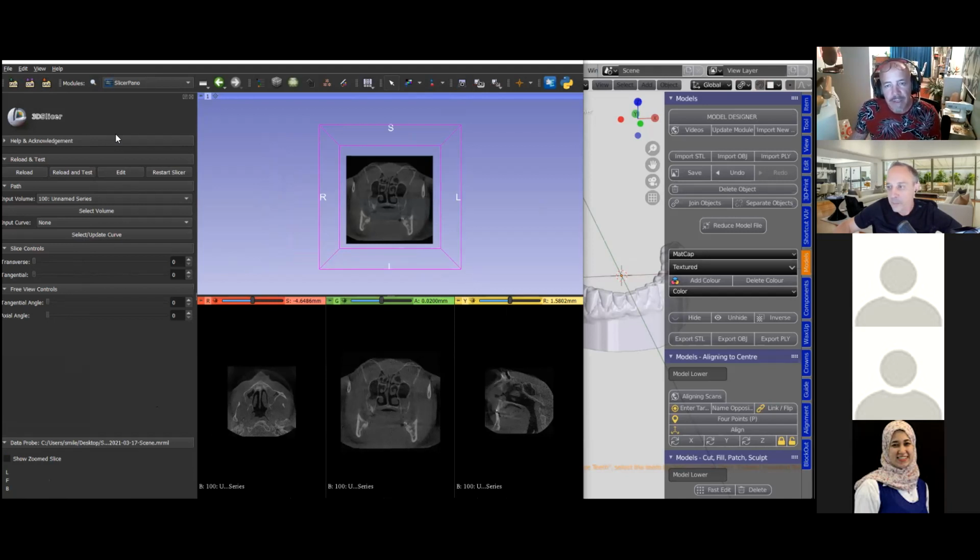The first thing is that we've got two add-ons in 3D Slicer. One is called the Slicer Link. It's one program which talks to the other program. If you've got a big screen, that's really awesome to use, but even better, I find, is to have two screens. Most graphic cards can plug in another screen, and some can plug in 4 or 5 screens. So it's quite handy to have two screens. Tonight we're just working on one on the Zoom.